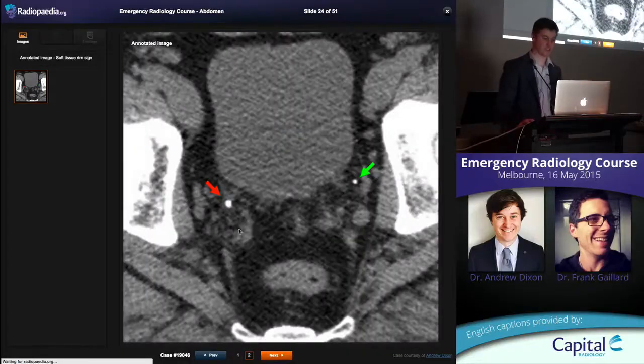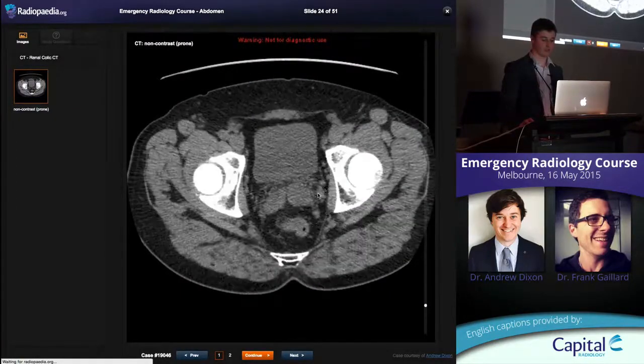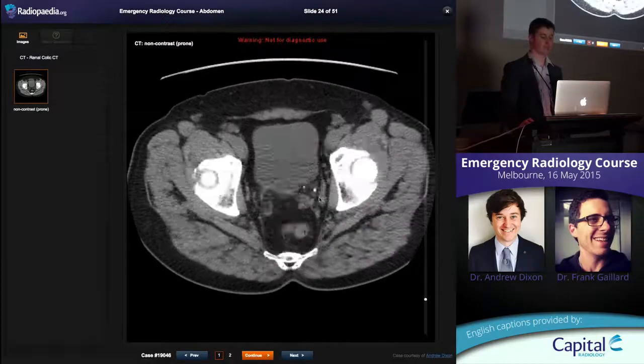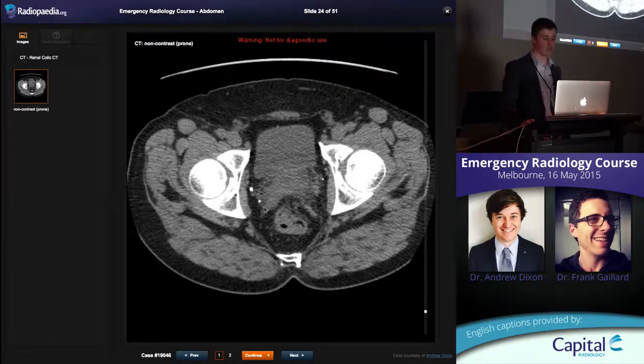That's just a zoomed up version of that soft tissue rim sign. Phleboliths in the pelvis are very common. Have a look at this. Look, there's 1, 2, 3, 4, lots of little calcified densities on the other side. These are little pelvic veins that thrombose off and form a little thing. They can have a comet sign where on one side you could have a little bit of density tracking into it, but they should have mainly fat sitting around them.